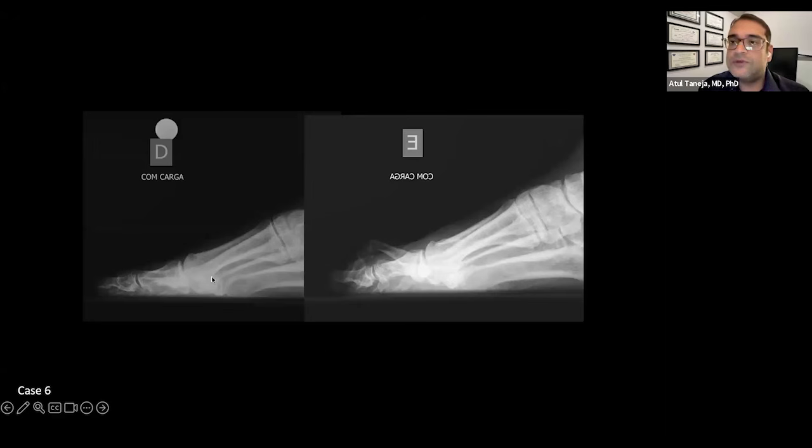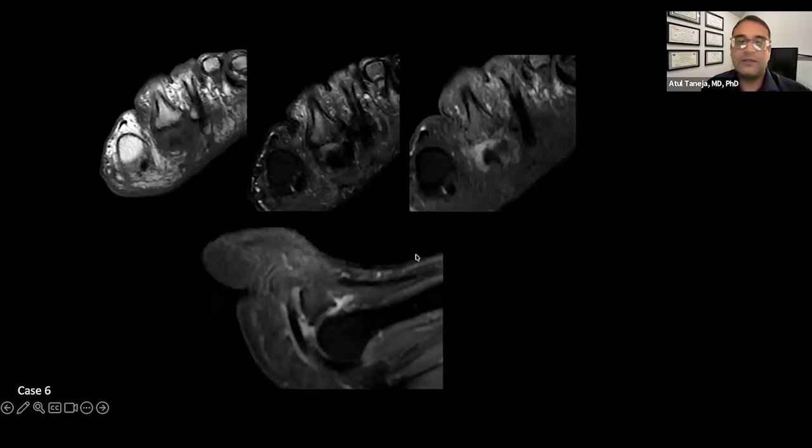Radiographs, sagittal view, lateral views of the right side, weight bearing, lateral views of the left side, also weight bearing. You can see the hammer-toe deformity of that side. And then another case, a more chronic stage, a lot of scarring, even some distension of the inferior recess of the MTP with fluid going between those planes. And we can see some joint effusion on sagittal.